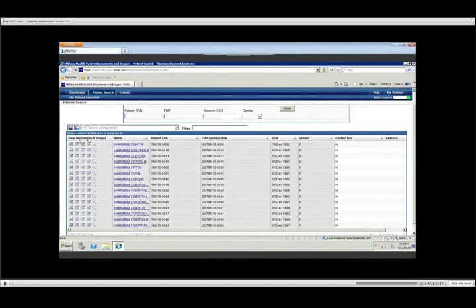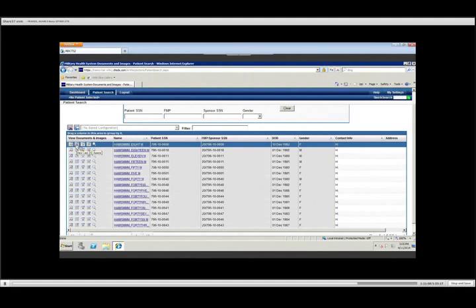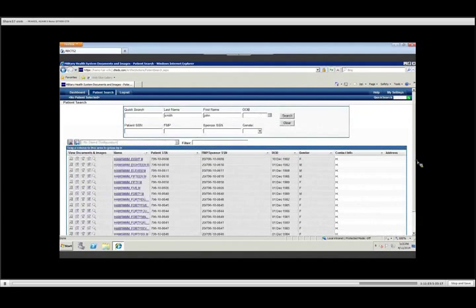I also have these four icons. The first one says View All Assets. If I want to see all of the assets for HAIMS 8, I would click here. The N will give me only the last 25 because I set 25 as my preference in the My Settings tab. The W, of course, is only going to show me the last week's worth, and the M shows me the last month's worth of assets that have been loaded. And the little spyglass lets me search specifically for assets. So any questions on the search screen?